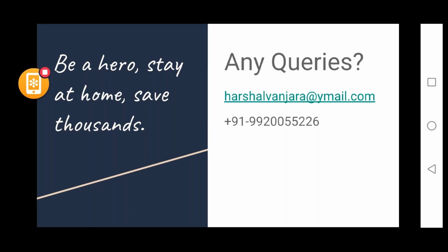If you ask me about the relation, yes, there could be a relation, because if there is a local steepening at any region of the cornea, then definitely you will see changes in the aberrometry. As I told you previously, you have to keep an eye on the vertical coma. So yes, there is a relation, not between the two machines, but between the readings and outcomes of both of them.